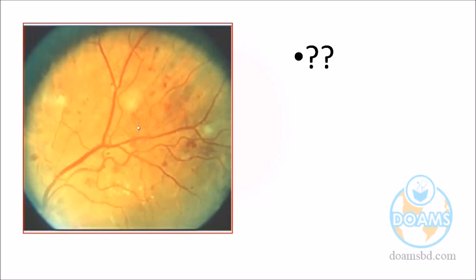There are some vessels. Neovascularization. If it is neovascularization, could it be hypertensive? No, it's diabetic retinopathy. Neovascularization is typically suggestive of diabetic retinopathy.